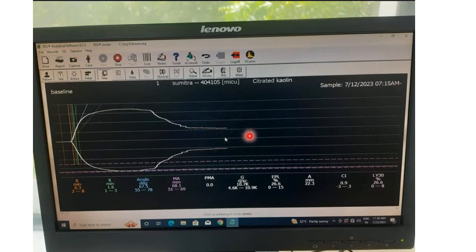So this was a post-operative patient who was bleeding from the wound after 3 days, and had an infection. We had to give blood components, and we wanted the result very quickly. At the same time, we didn't want to give her more and more blood because she was in volume overload as well. So we did the TEG, and how will we interpret the TEG report? Let's see.